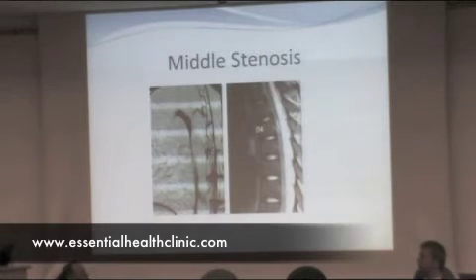Again, this is a very nice demonstration of the association of venous malformation with lesions in the spinal cord. This patient has very tight narrowing of the azygous vein, and you see the reflux of the contrast into the spinal cord and down into the left renal vein. And this is the MRI of the dorsal spine for the same patient. You can see the lesions. It's very, very close to the basivertebral vein.